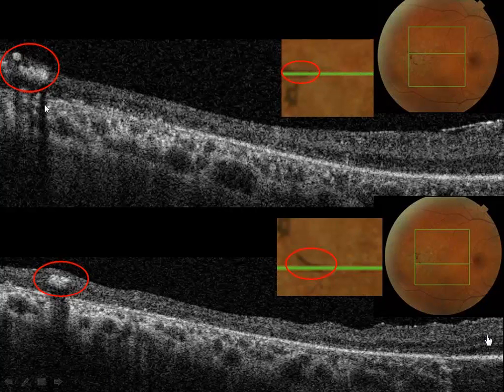So pigment's usually down here, of course, in the outer retina, where the retinal pigment epithelium is supposed to be. But in retinitis pigmentosa, we often get pigment that migrates to blood vessels. The blood vessels are actually within the retinal nerve fiber layer, which is the superficial retina, or the inner retina. And here we're getting pigment migrating. We can actually show that, and we've shown this in many, many cases. So pigment in retinitis pigmentosa, and in some other disorders, actually does migrate from the outer retina to the inner retina, and often wraps itself around blood vessels, the bone corpuscle type pigmentation.